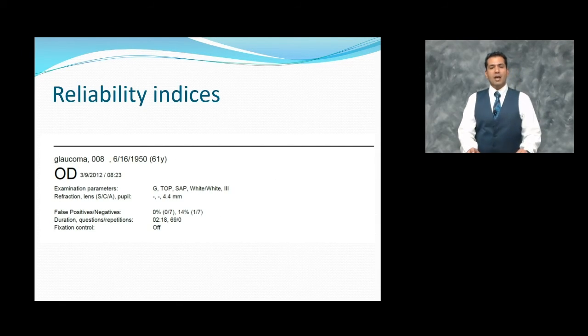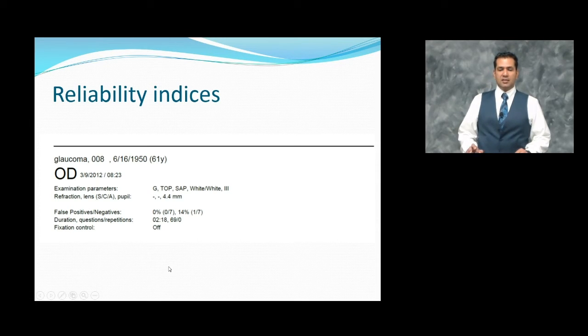First, let's look at the reliability indices. The most important points of reliability indices are to make sure that the name of the patient is correct so that it gets recorded in the right database. The date of birth is very important because each patient's data set is compared to their age-matched normal. So if the date of birth is wrong, then the data is compared to an incorrect age group.